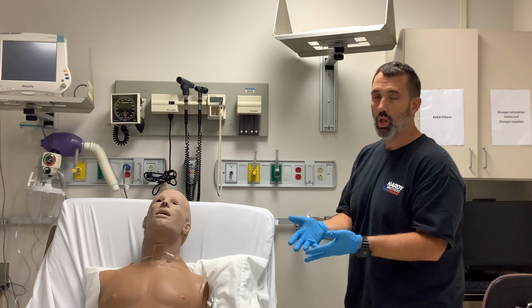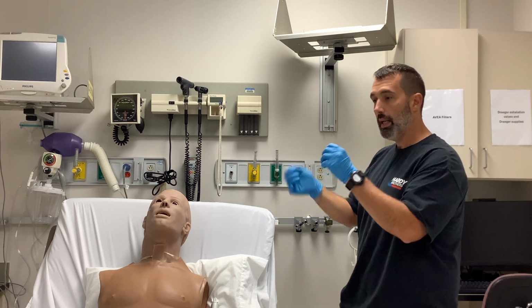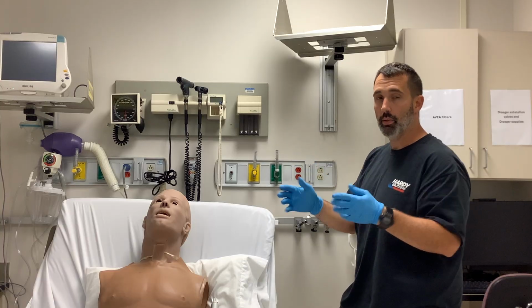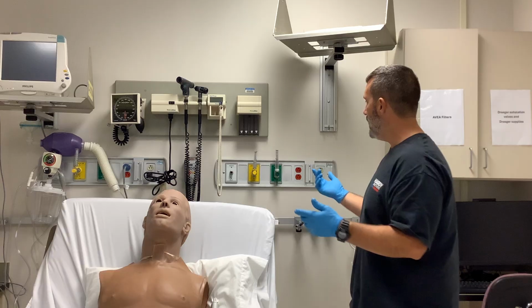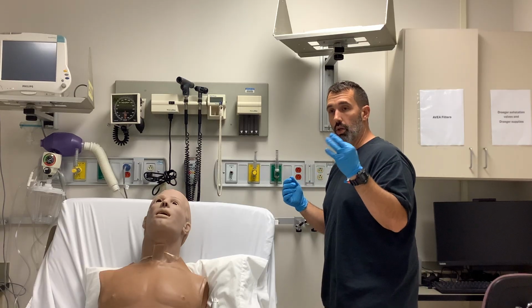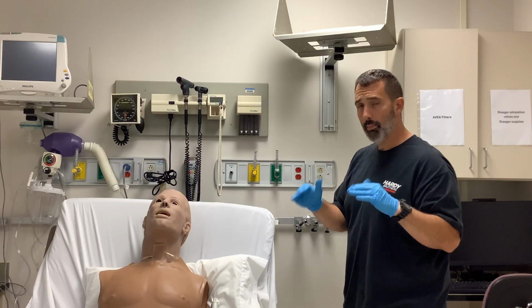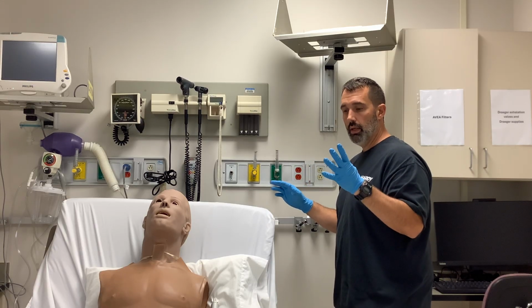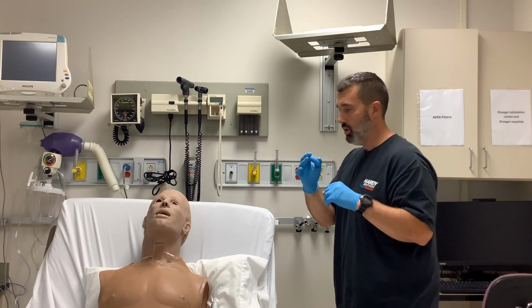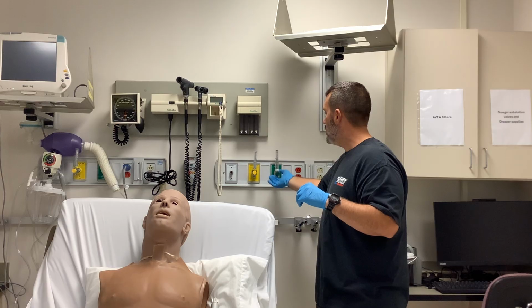So if you're going to utilize an old school system of taking an oxygen flow meter and an air flow meter, and blending your own gases to essentially create the amount of oxygen that you want, what I would do, because it's a 3-to-1 ratio, and that would be super low flows, but just for the sake of simplicity, I'm going to utilize 40% with a 3-to-1 ratio, and I adjust my oxygen flow meter to 1 liter per minute.